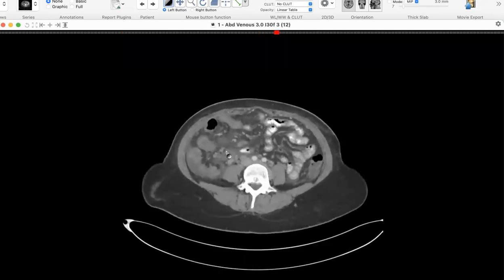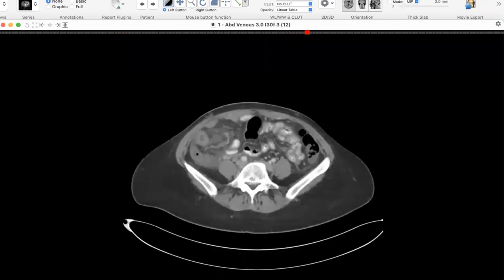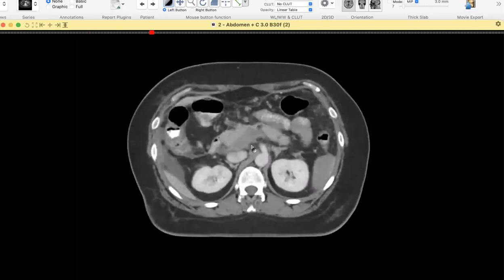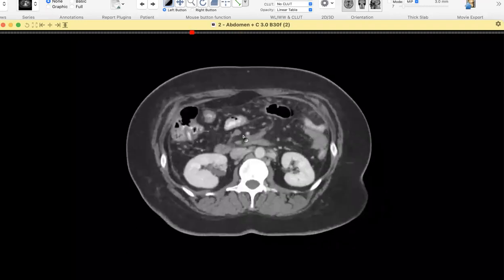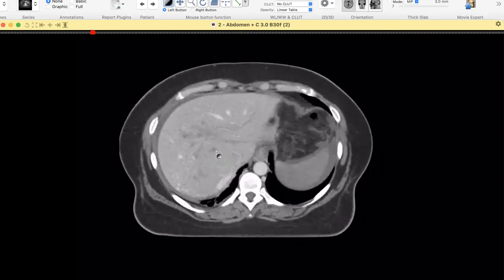And I feel at this point there is also thrombus which has developed in those collaterals, which is leading to these venous ischemic changes. So this was 4 years ago. This patient had a well-developed thrombus within the portal vein as well as the superior mesenteric vein. Right.